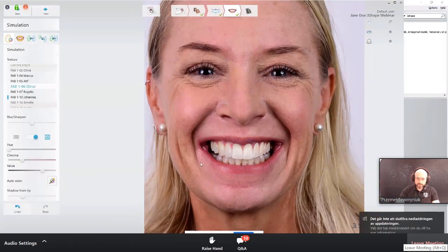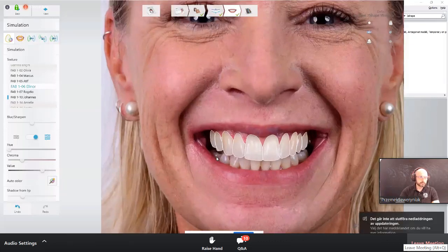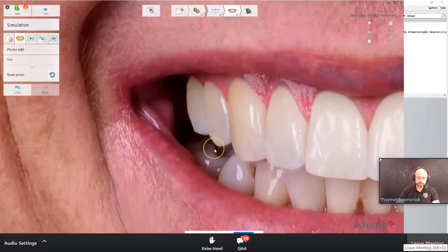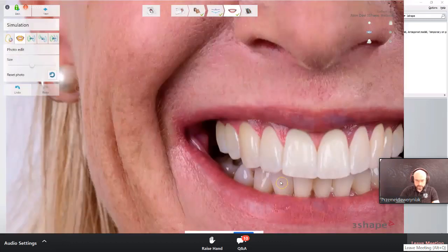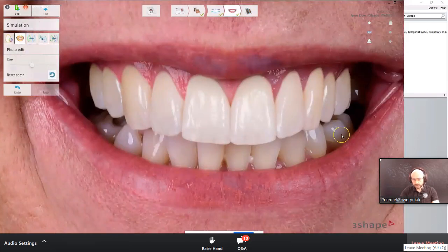And now we have this part sticking out. This is not so much, but we have some nice tools here, so we can edit this. We can just move it in. And maybe I have something sticking out here as well, a little bit. And we can just move small pieces in the picture.